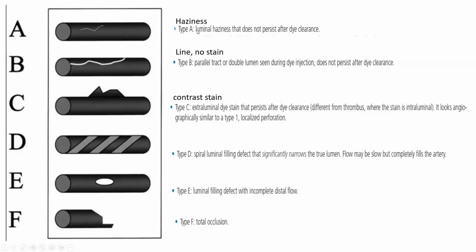A means a little bit of haziness that clears quickly. B means a line that also clears quickly.